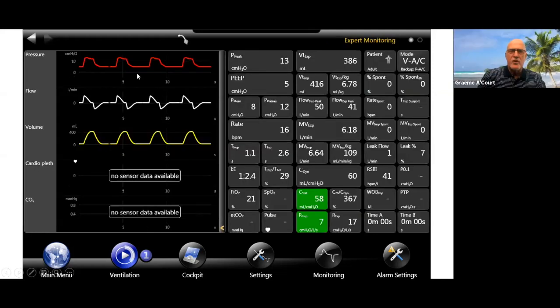So this is what I wanted to show you. What I have on the Bellavista is what can be monitored. There's a lot more stuff there as well. If you want to, you can go crazy and show stuff where you'll go brain dead if you really want to. But you can see that anything possible that can be measured is being measured. So again, on the new vents, this is what I think is great, because we have access to information that before we were guessing our way through.